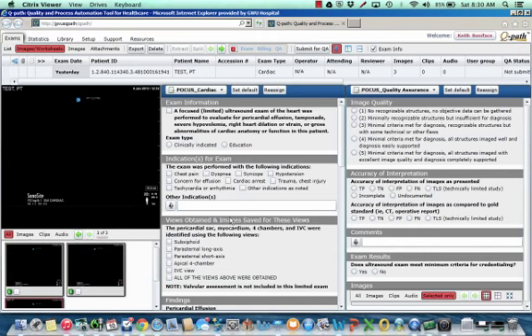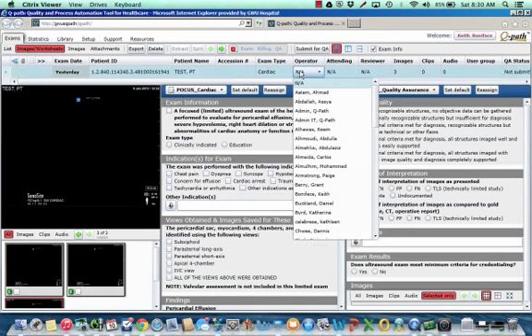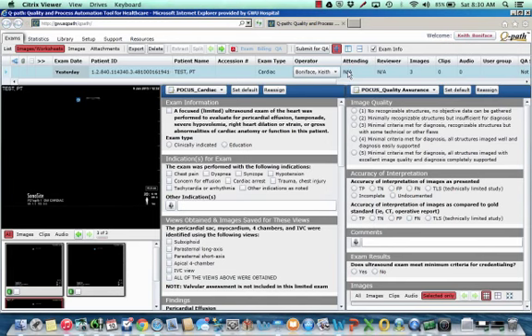Now as you look up here, you see that you have the patient medical record number here, the name is here, and your name should show up here. If it doesn't show up here, you can click on this here and you can toggle your name. So I'm going to click Keith Boniface.